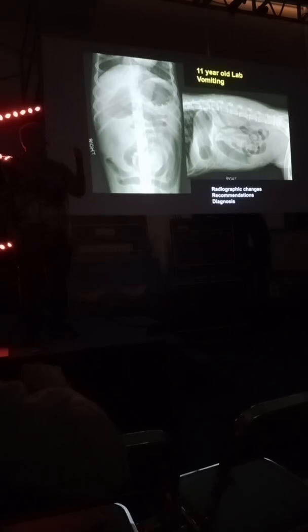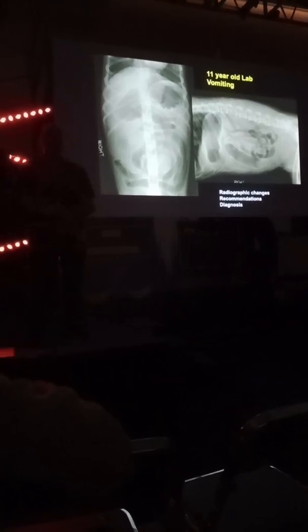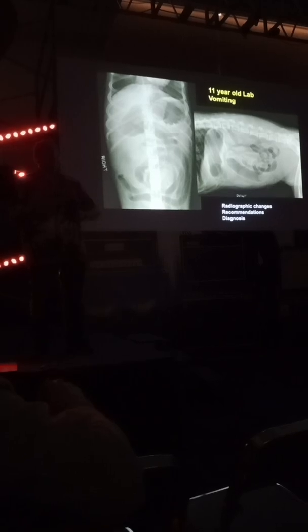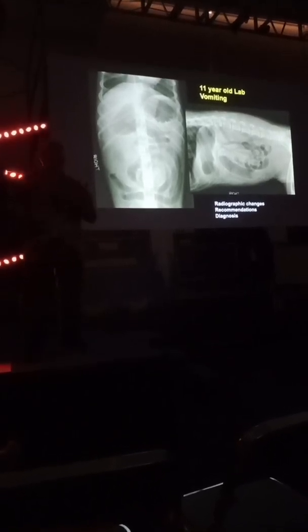Is the stomach distended with gas, fluid, or both? Gas y líquido. It's really mostly gas, because look how black it is. It's actually more black than it is gray. Now there's probably fluid in there, so I'll take both. But it's not that dramatically gray. So I'm thinking it's more gas, so good pickup.